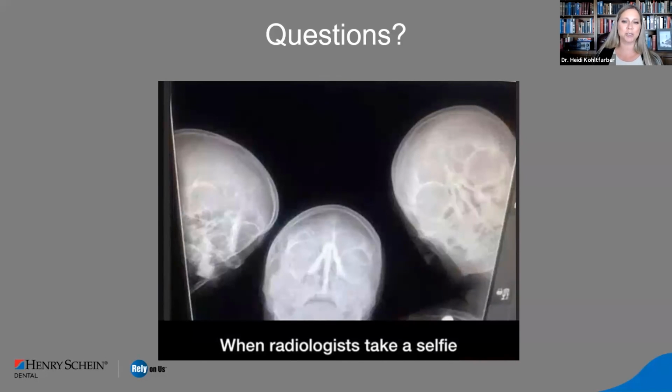Just like the one I showed you that was osseointegrated along the lateral cortical border of the nasal fossa. Obviously, that did travel, and they will. We do have some amazing anatomy within our sinuses. We have all of the little cilia that help to move and facilitate the mucosal thickening to drain properly through the ostium. And it can do the same thing with our little implant. It can move it along with that mucosal thickening. So yeah, it can move.